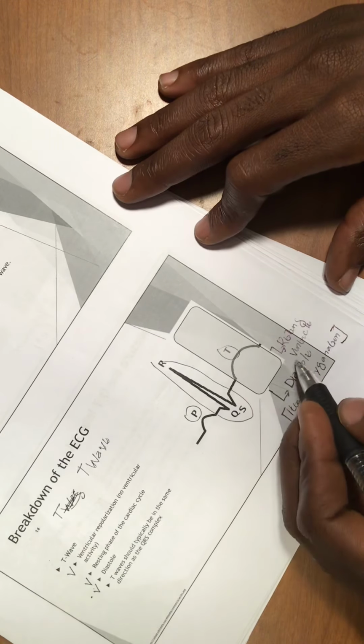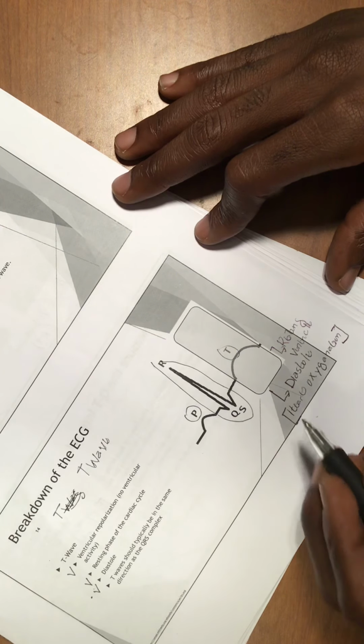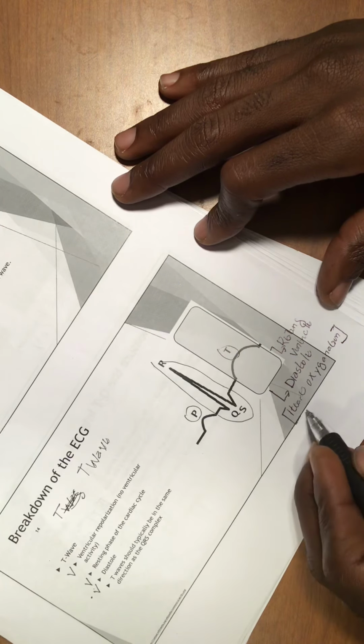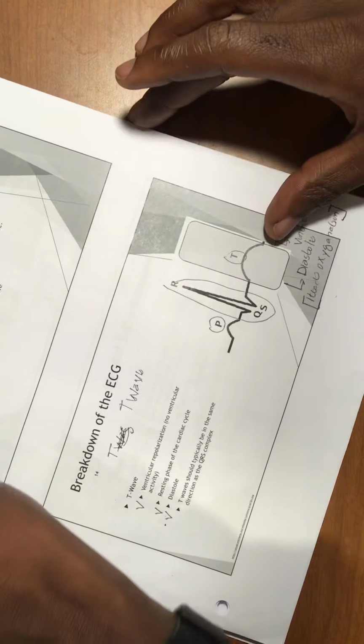And I noted it right here. If you can see it with me, this is the time your ventricle is resting, and this is the diastole, and the heart oxygenation is done in diastole. This is when they receive the amount of blood that they need. This is very, very important, guys, to know about.